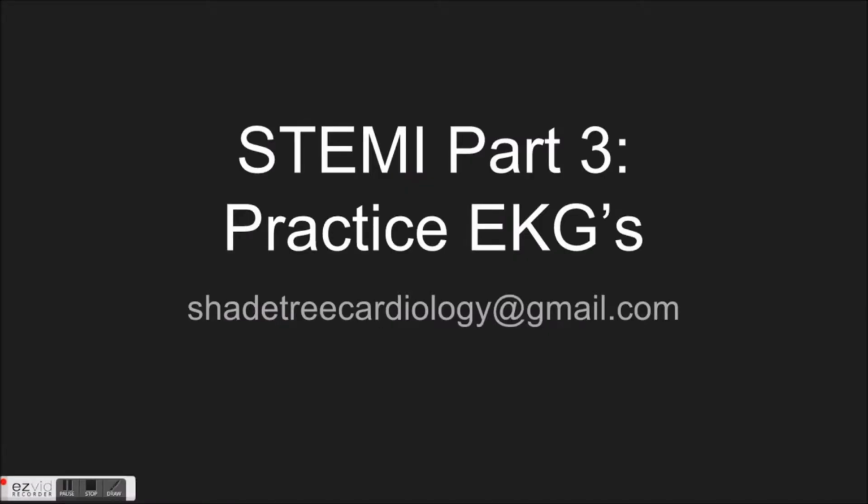All right, so part 3 in the STEMI series. We're going to do a couple of practice EKGs here. We're going to do about 5 or so on this.